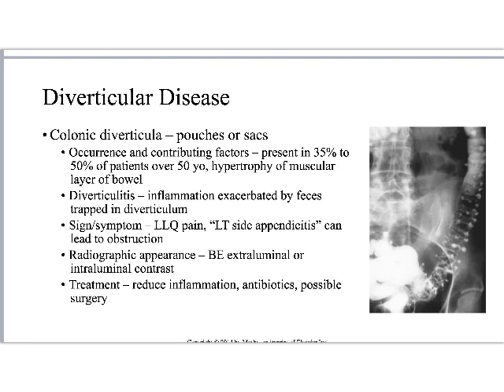This x-ray is crazy. I mean, the number of diverticula on this image. Has anyone ever seen this stuff on x-ray? I mean, that's a pretty good case to study right there. Generally, you might see 2 or 3 of them or something. I mean, I didn't even count. It's close to 20. We will see extraluminal, that just means not in the area of the normal bowel, right? Or intraluminal contrast. So there might be increased amounts of contrast within the lumen itself, so within the bowel itself.